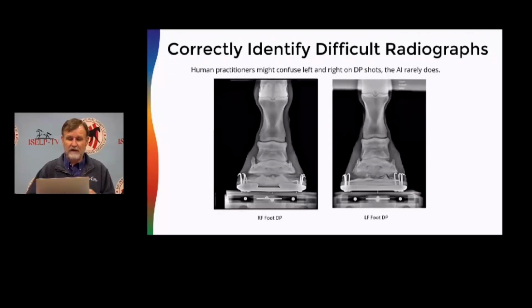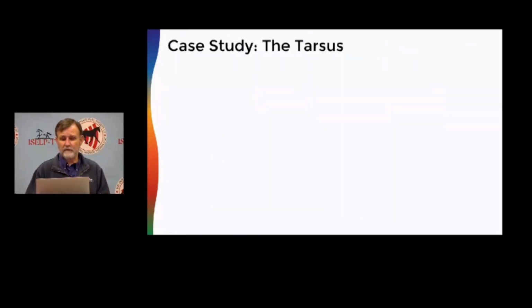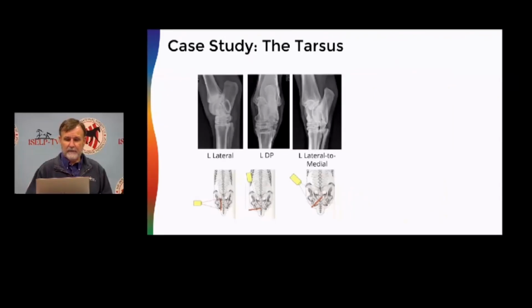So we check it, we find out it's right, but now that gives us the opportunity to go back and look again and say, what is it that the computer sees that I don't? What is it seeing with its 16,000 dimensional thinking that I'm not seeing with my 3-dimensional thinking? And what we found on at least the front foot and fetlock is we think it's the lateral aspect of P1 is always more curved than the medial aspect. And we find that's true both for front and back feet. So this is what we think the software is seeing. Let me back up again.